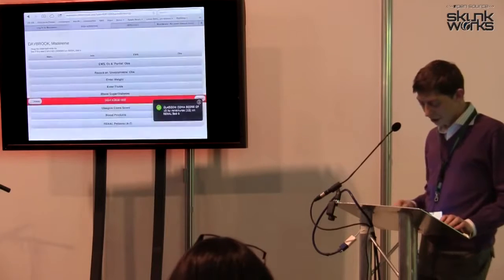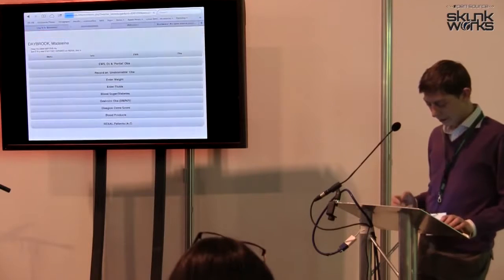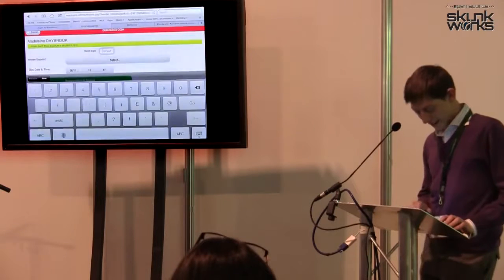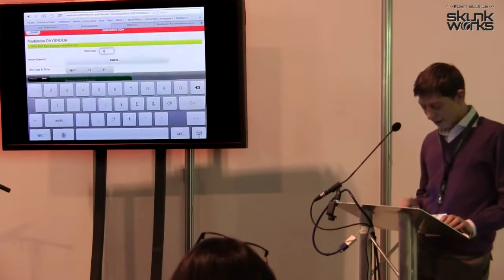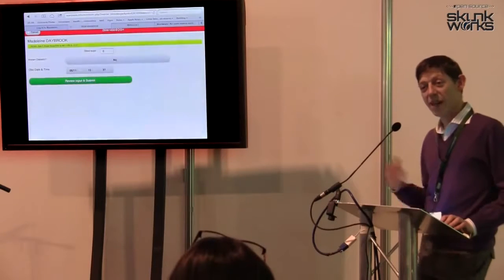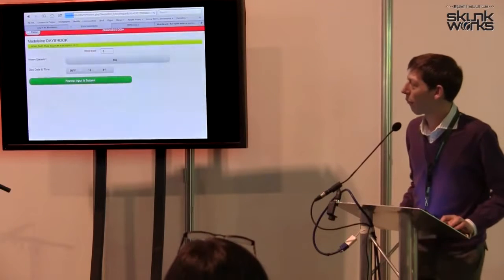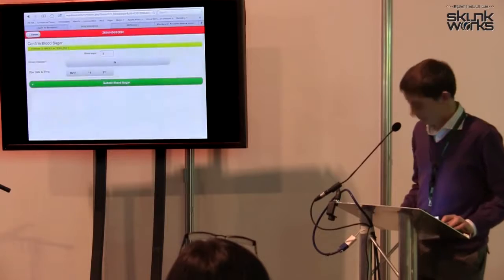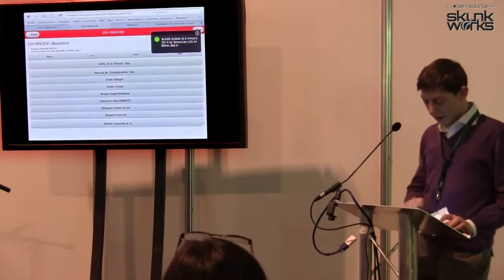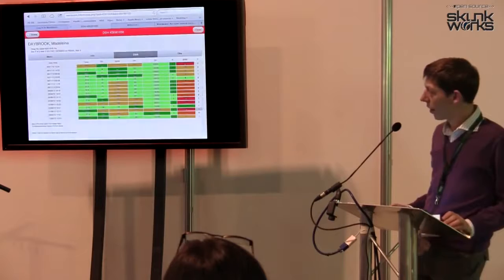We could also do their blood sugar quickly as well now. I happen to know that she's not a diabetic because it's my fictional patient. So we'll submit that information as well, and we'll just confirm that. Okay. So we've got all the observations in here, we've done that. We can just review those observations as well.